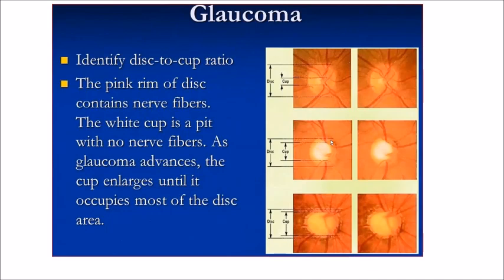The white area is the optic cup. Usually it is less than 50% of the total diameter of the optic disc normally. Significant widening of the cup is called glaucoma, raised intraocular pressure, meaning the pressure inside the eyeball is high. So retinal vessels are actually pushed. This is the confusion with optic atrophy, as these are also white areas, but these are due to cupping. And the pressure also causes optic atrophy, no doubt. It is called glaucomatous optic atrophy.